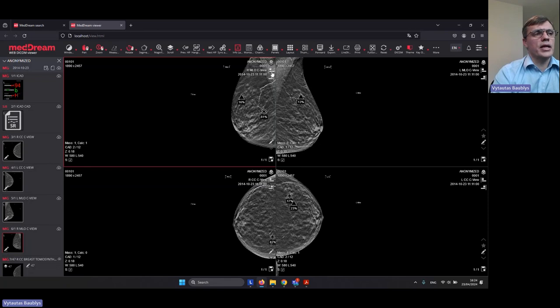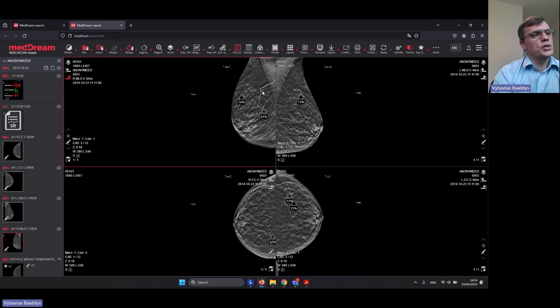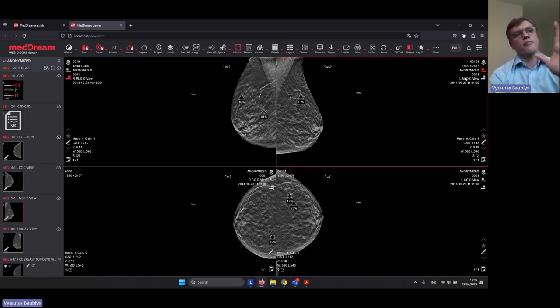If I click alignment, as you see, it moves all the demographic data to the left. Now I would like to move from this image, so I can again select what I'm aligning to this border, and automatically my data is moved to the right position.